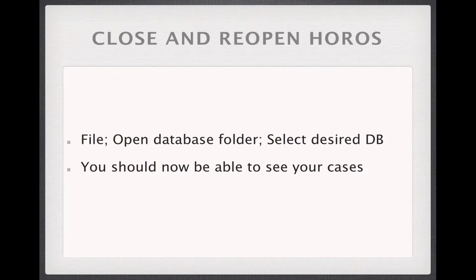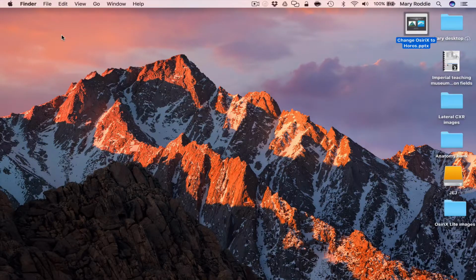You then need to close and reopen Horos, and if you then go to the File menu at the top, open the database folder and select the desired database that you've just edited, once you open it, you should now be able to see all your cases. So let's see how to do this in real time.